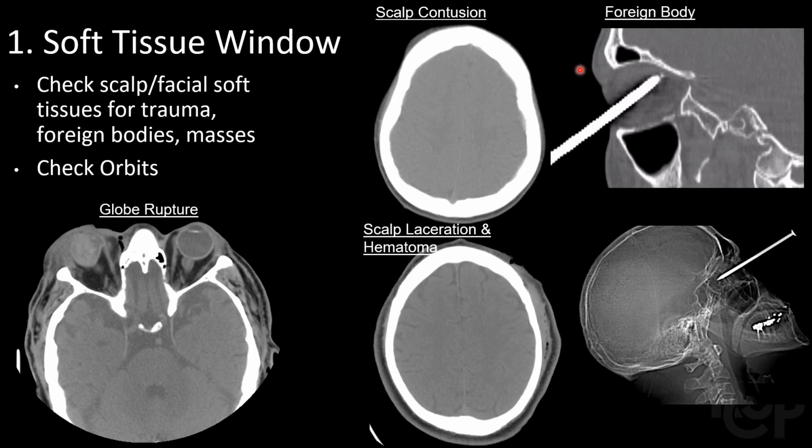If we move on and take a look at these two cases here, when you're assessing the scalp, it's important to just trace around the patient's calvarium. On the case at the top here, we see a clear asymmetrical prominence, likely corresponding to scalp contusion.